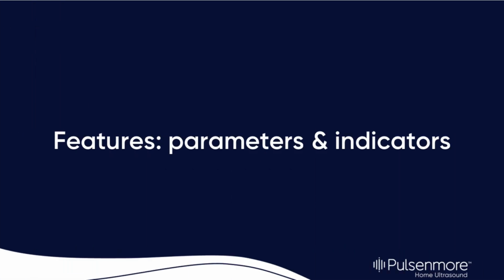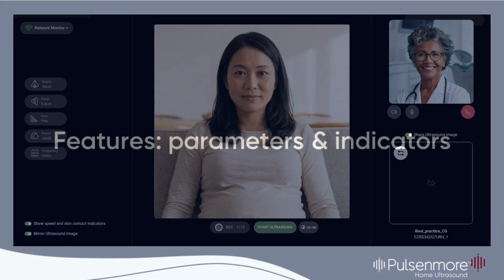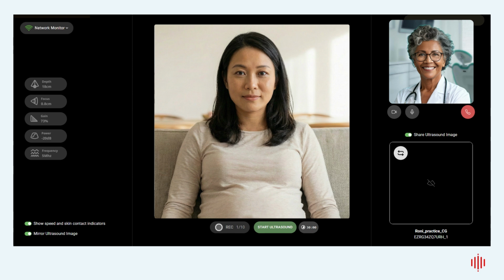Now let's see all the features available during a Pulsenmore online ultrasound consultation. After accepting the patient, the top right of the screen displays the clinician's camera feed, while the patient's image appears in the center. You can switch the locations of the scan view and patient view by clicking here. At any point during the call, the clinician can choose to share the scan imaging by sliding the button here. The microphone and camera can also be turned on or off during the call.